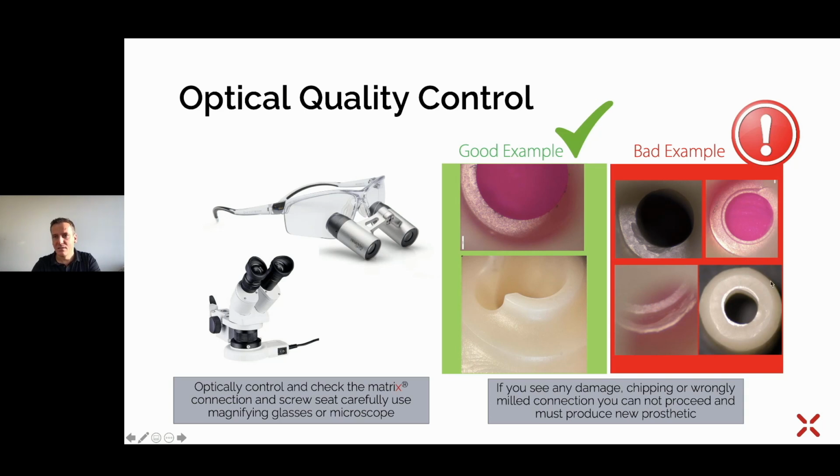And here you can see a really bad milled connection, the matrix connection. This is not possible. The milling strategy was not working here, so this is a no-go. You have to repeat the work. This is how it has to look.